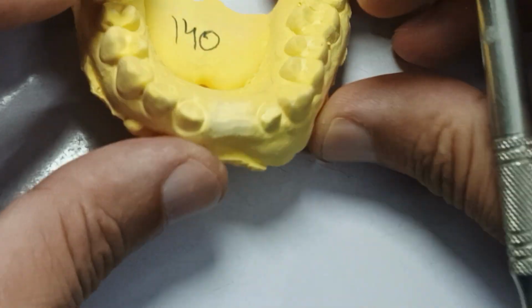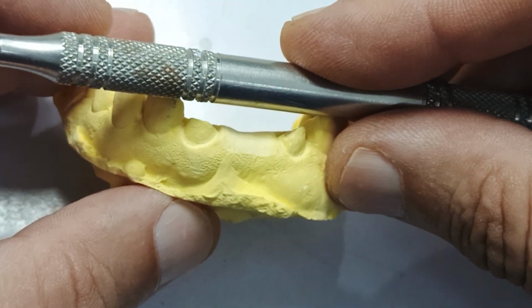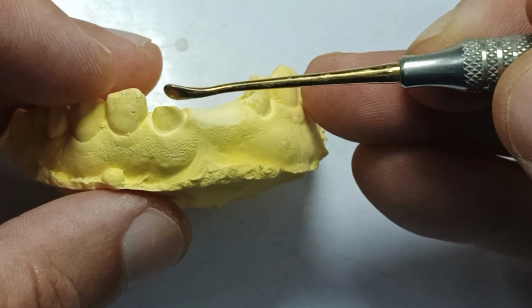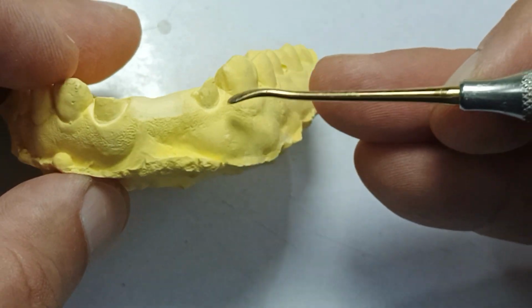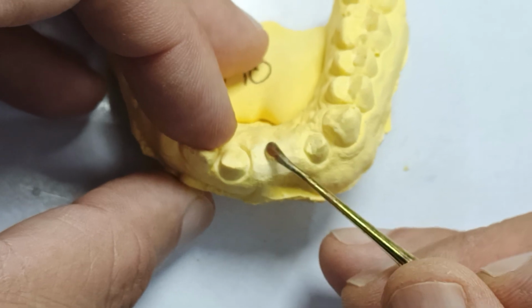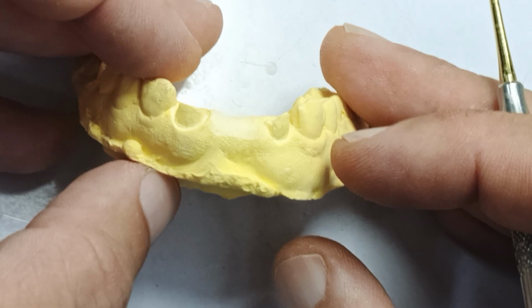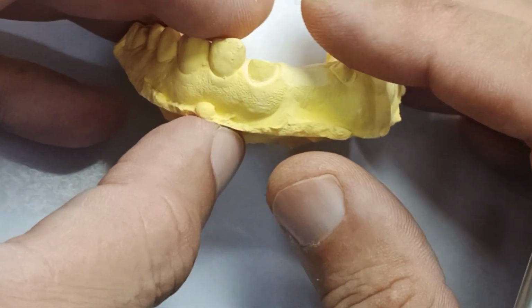Now you look at this. This is supposed to be a bridge. What happened to this? Look at this area. The reduction is ridiculous. This is too much reduction. This tooth should have been prepped only till this level right there. Only 1.5 millimeters or 2, and this is total overcutting. Look at this lateral incisor, totally cut sideways. And then they're asking the lab to manufacture a bridge, so it is stuck into the ridge, and that's called the ridge lap design. That is going to cause infection, and the soft tissue is not going to be cleanable. Where is the bridge for this? Where is the bridge? So we'll put this aside.